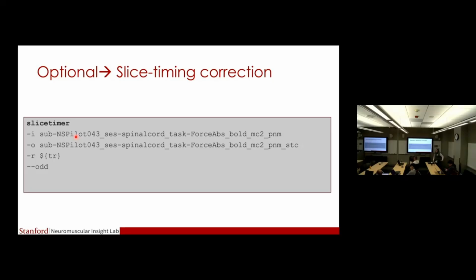It's been an argument. This is why I also called it optional. To me, the decision should be based on the scientific rationale rather than on whether the results look good or bad, right? And to me, the rationale makes sense that if slices were not acquired at the same time, and you're after an HRF representation or task-based fMRI, then slice timing makes sense. The interpolation, though, is a valid point.